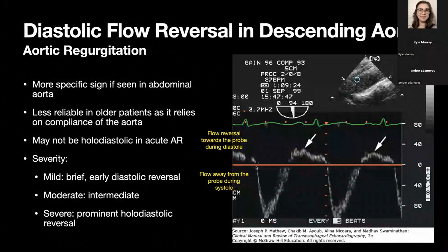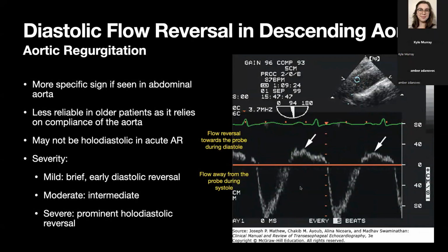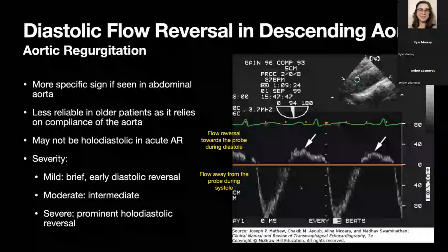What if you have really, really bad regurgitation? Could you see some backward flow in the aorta? Sure. You can actually, right? It's going back into the heart. That's what you're looking for. Or if you have a VA cannula in. Yeah, if you have a VA cannula, you're all messed up. You ain't getting this. Hopefully you don't have a VA cannula in the ICU with severe AI, or you're going to be in trouble.